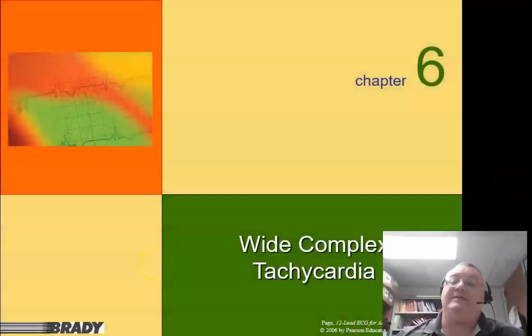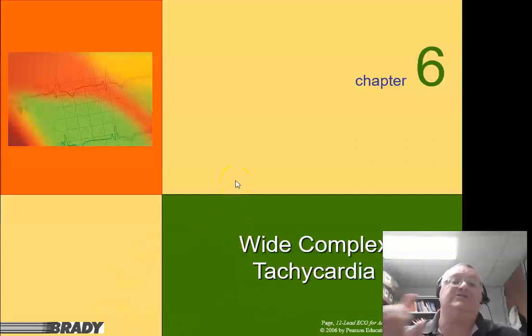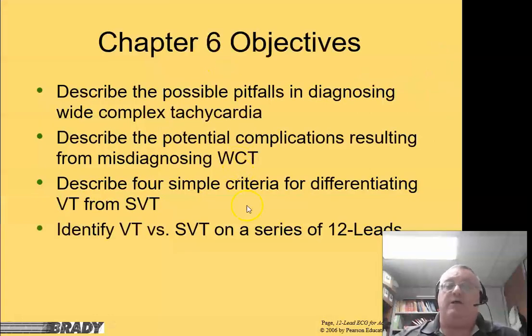Way back in video number 1, I said one of the things we use a 12 lead for is to know whether or not we have VTAC. So we're going to talk about the wide complex tachycardias and why they throw lumps into here, and how we can use the 12 lead to determine where that wide complex tachycardia is coming from. Does it change our treatment modalities? The answer is yes, very much yes. So let's figure out what it does.